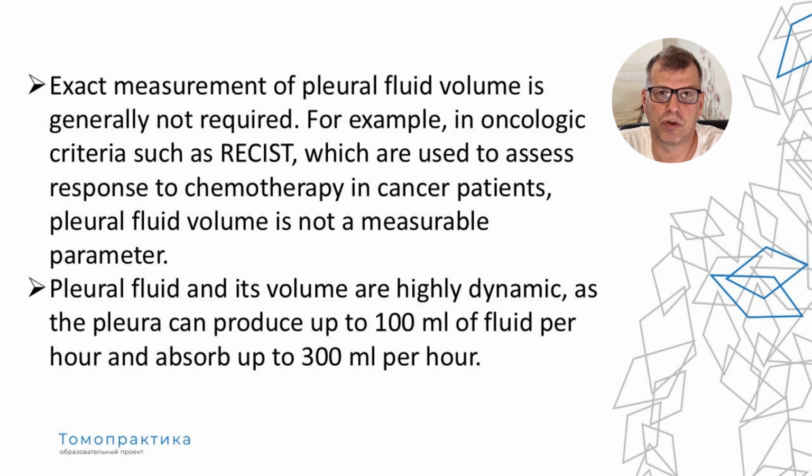In most cases, you don't actually need a precise measurement. For example, pleural fluid isn't even listed as a measurable parameter in oncology under the RECIST criteria, which we use to assess how patients respond to chemotherapy.